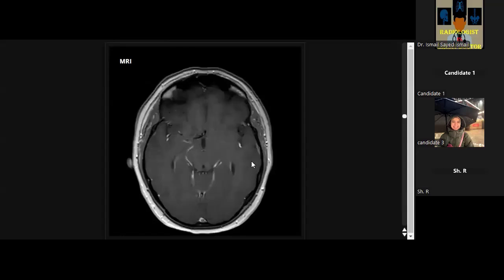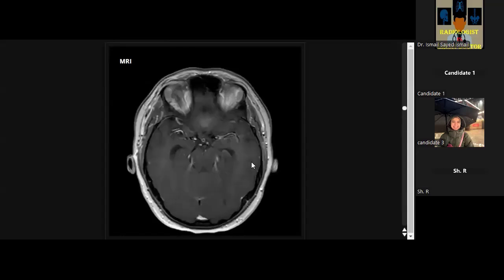So conclusively, I can see a homogeneously enhancing lesion within the fourth ventricle, with positive mass effect and hydrocephalic changes as well as tonsillar herniation. This is an emergency. I'm going to pick up my phone and inform the neurosurgical team because this patient will require urgent VP shunt insertion. As regards the lesion, due to the homogeneous post-contrast enhancement, in my routine practice I would like to correlate with the CT images if present, because I'm very concerned, given the post-contrast enhancement, about meningioma.